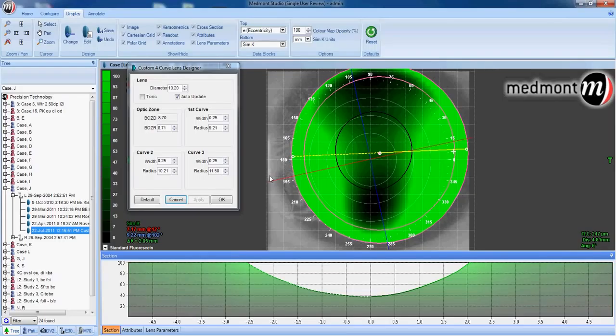So you can determine which contact lens parameter would be ideal for this eye. In this case, a scleral lens may be best suited for this patient with such asymmetry and such a steep horizontal meridian. A piggyback might be another option as well.